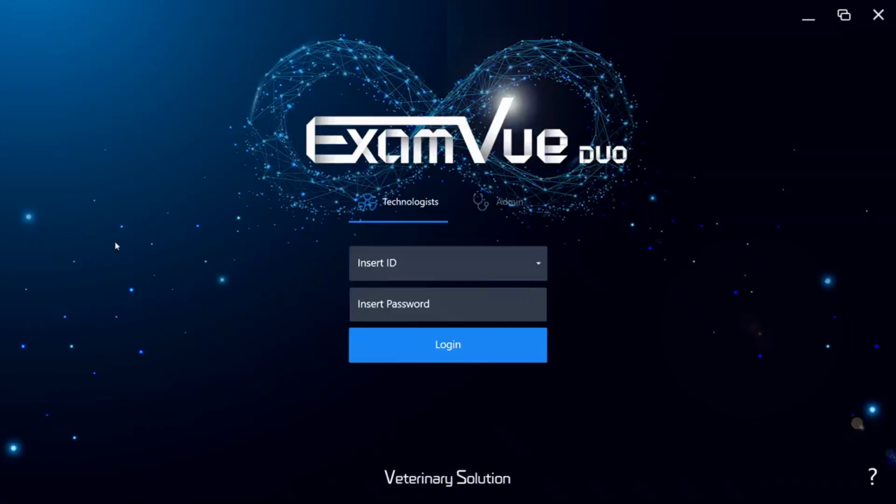Hello, and welcome to our demonstration of ExamVue Duo X-ray acquisition software. We're very proud of the work we've done on developing the software to be as easy to use and learn as possible while still having the full features you need for your practice.